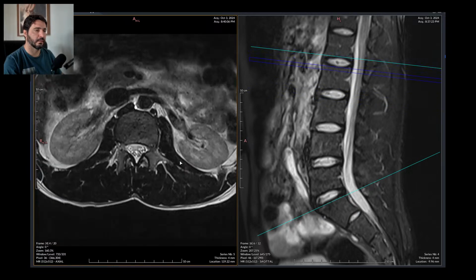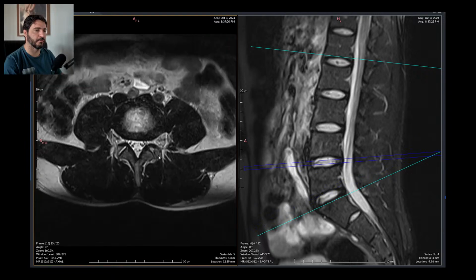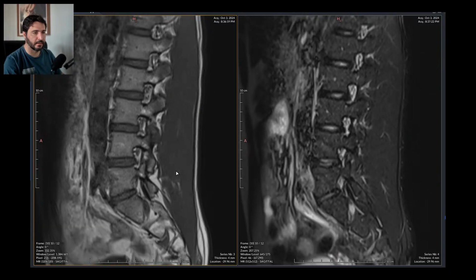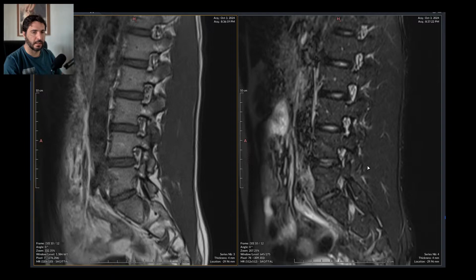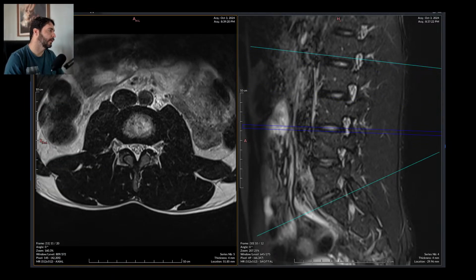So I think there are not enough signs of degenerative disease that could be properly classified as arthrosis, but there are some signs of hypermobility or synovitis, acute inflammation of these joints right there. So let's finish this up. Facet joints have proper morphology, but they are filled with liquid.